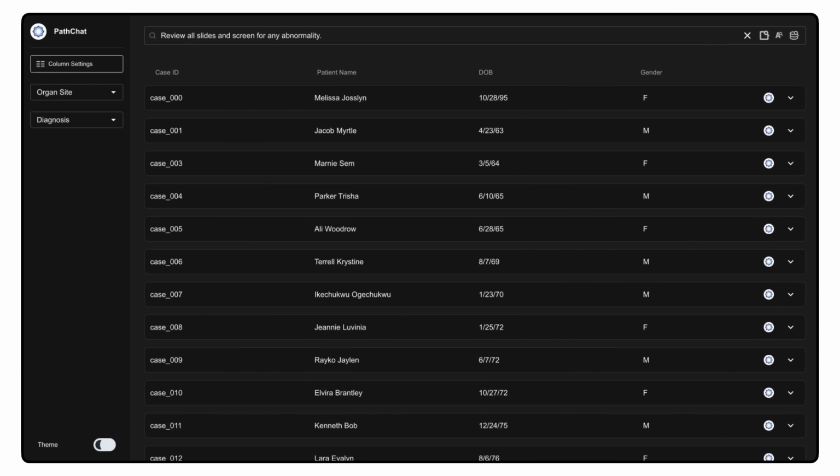Hello, I'm Drew, and I'm excited to introduce PathChat 2a, a new pathology workflow assistant from Modela. PathChat 2a extends the power of PathChat to include agentic capabilities to operate horizontally across a pathologist's workflow, operating as a co-pilot by triaging cases, automatically ordering IHC, suggesting differential diagnoses, and more.